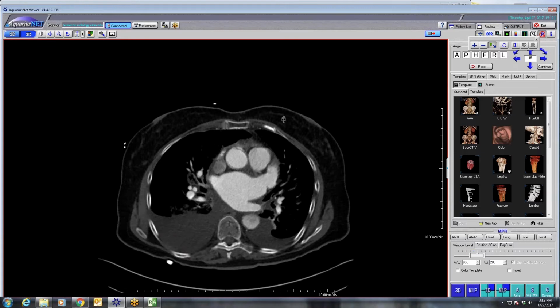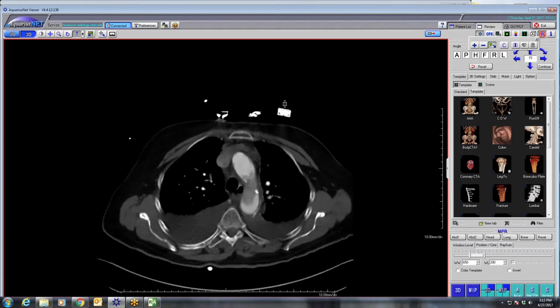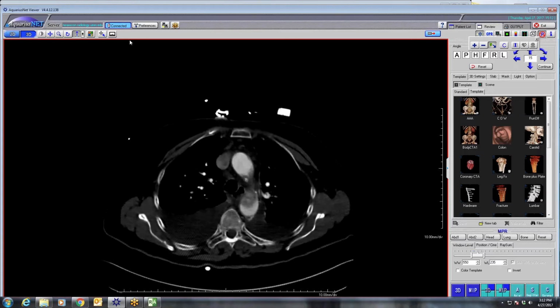If you put a region of interest on an area like somewhere there, what numbers do we get more or less? 140 and 140, and then here it's 330.